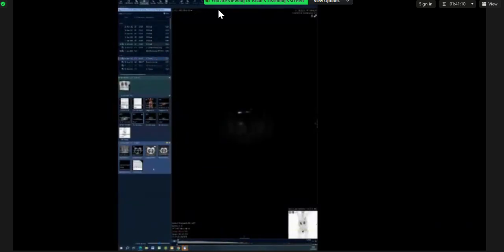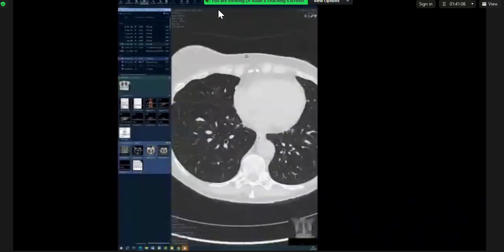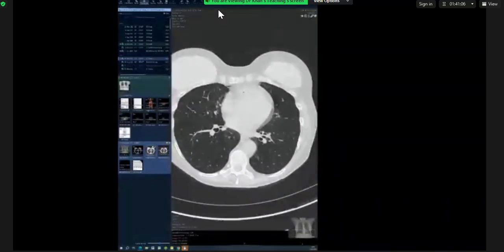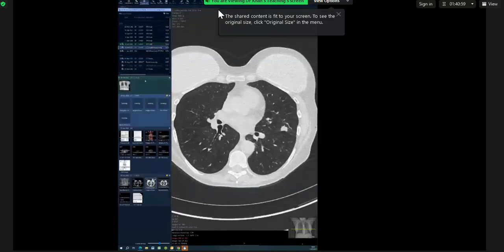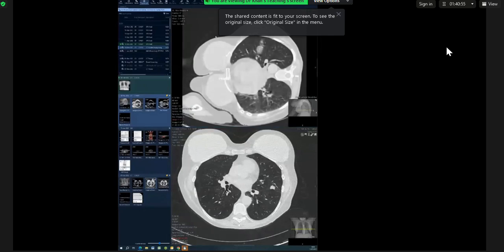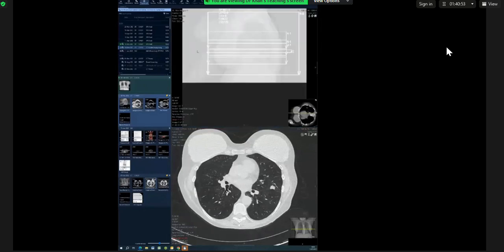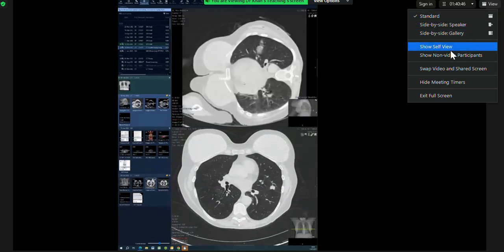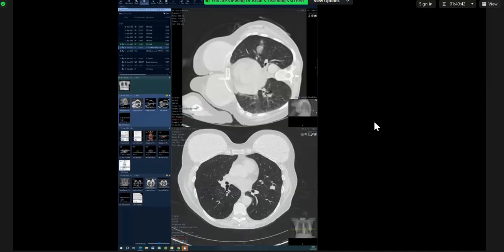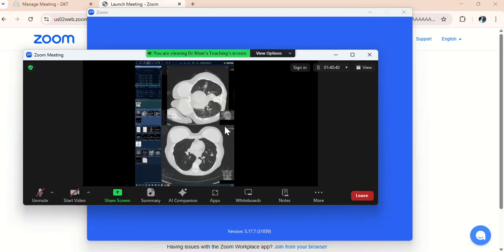what do you want to call it? What do you want to do to it? I want to biopsy it because the patient's symptomatic and we don't have a definitive diagnosis. Yeah. Probably the left opacity, the left nodule, is a target for biopsy, CT biopsy.